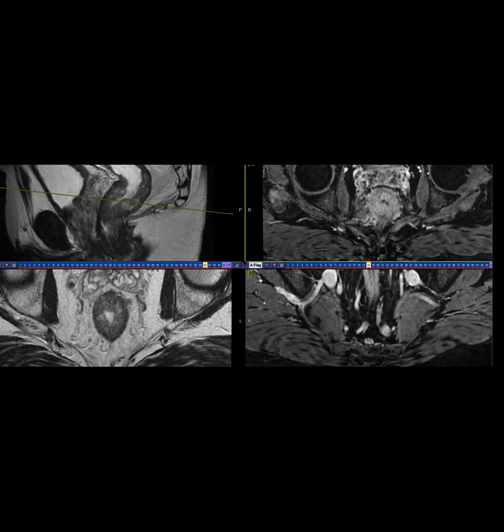Yes. Okay, perfect. So maybe the cases are not as interesting as your cases, but just a couple of cases with some interesting findings. So this patient, 52-year-old, was referred to us with rectal mass for staging, basically, and they've shown the key images that we highlighted.